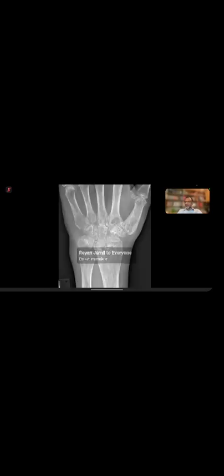Let's go back. Okay, all the differentials you mentioned are correct. I would call it rheumatoid arthritis. I would call it septic arthritis because there's soft tissue swelling, erosions, osteopenia. Everything fits in both conditions.